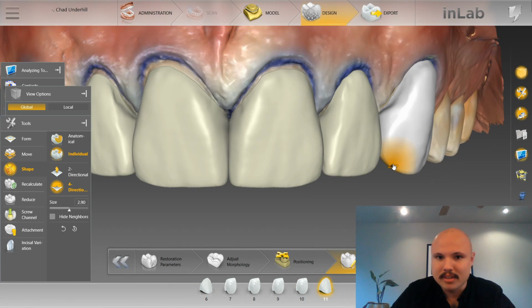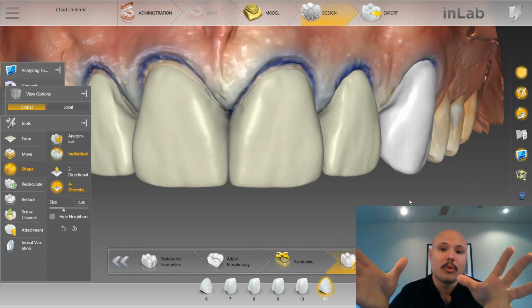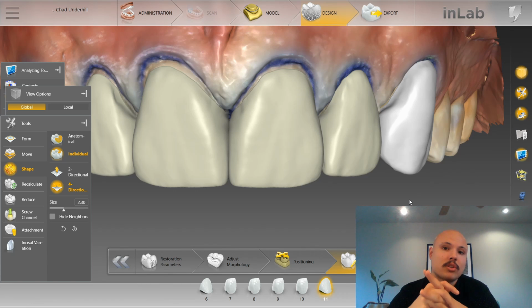Now, I'm not trying to give this person my teeth, but I do like seeing those natural asymmetries, and I think that it makes these monolithic restorations pop more and appear more natural, because it's really easy to end up with a fake looking tooth if you're working with a monolithic monochromatic ceramic block that's simply spray glazed. Nothing wrong with that, but to really bring those crowns to life, it's good to make the shape of the teeth really pop.